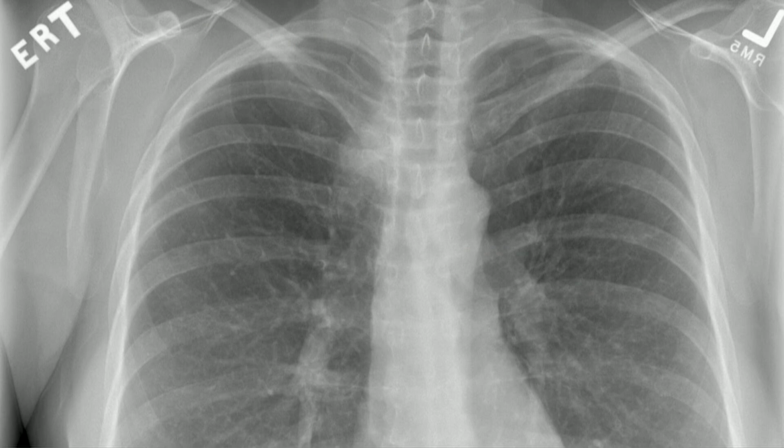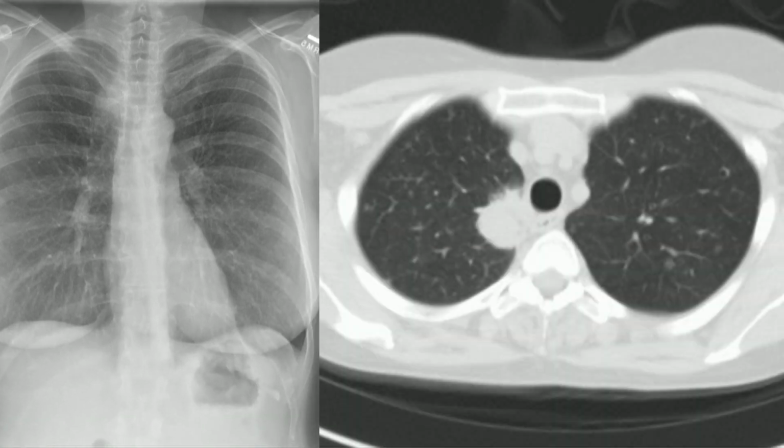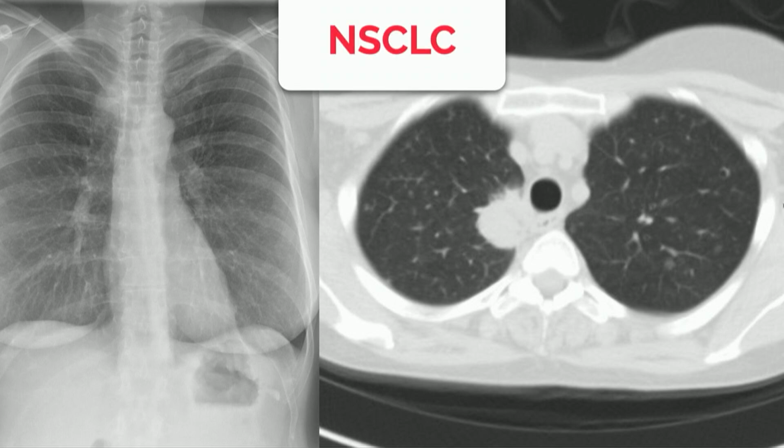Here we have another one. So again, we have this area. It's a soft tissue abnormality. Portions of the paratracheal stripe are not well defined. And so on the CT, this is what it looks like. Anteriorly, we can see this portion here of the tracheal wall, it's aerated lung and the trachea, but most of that paratracheal stripe is opacified by an abnormality, which in this case turned out to represent lung cancer.